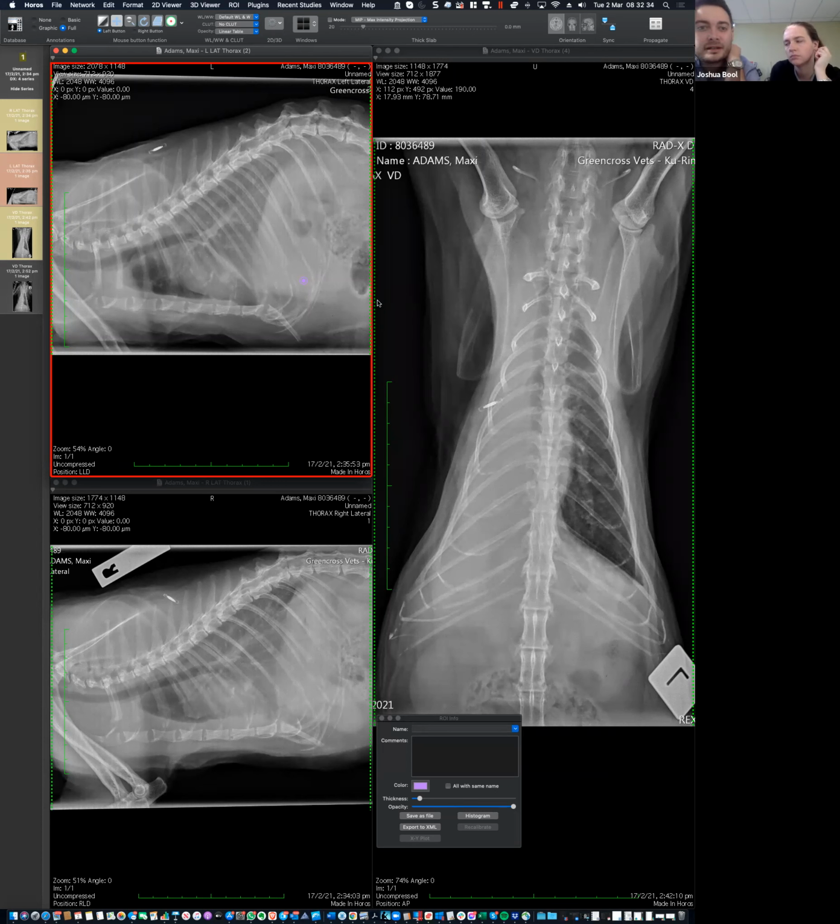Neoplasia would be one, definitely could cause bleeding and fill up the lung lobe, would fit also with the hypercalcaemia potentially. Lung lobe torsions. Yeah, torsion was the next thing I was going to say. I'm not sure. You have to have all of them.